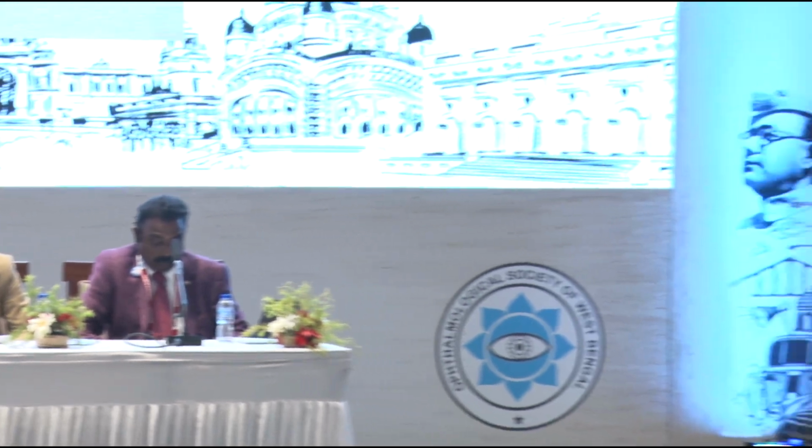So my question would be, let's say there's a patient of PCV that comes to you. Would you be doing the multimodal imaging? Let's say you do the OCT first, or do you go ahead in the first? I should say that I'm a vitreoretinal surgeon and do ocular oncology. I don't do medical retina, I'm afraid.